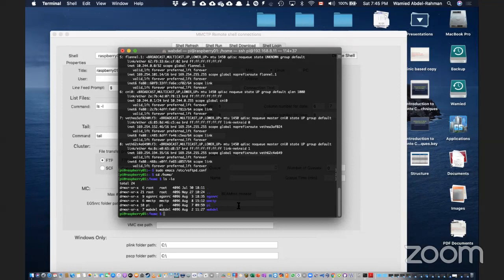The reason why I like to do it this way is, for example, I want things done for calculation of treatment planning with mmctp to be placed in one folder. And then I have my own stuff. I want to, for example, determine a correction factor for a chamber or whatever. So the EGS beams and so on for my use are different than what we will need for MMCTP.